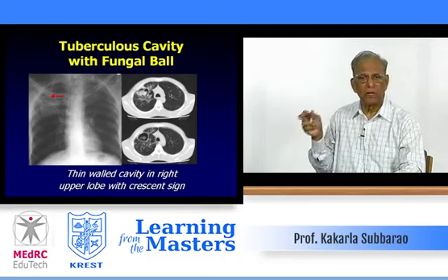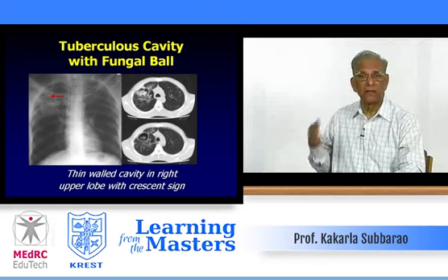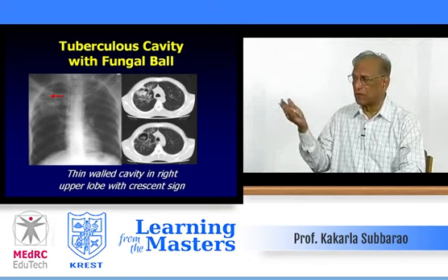It looks like a ball. Actually, it is debris, some blood, and fungi, all together forming a ball. You could see this ball nicely on CT.